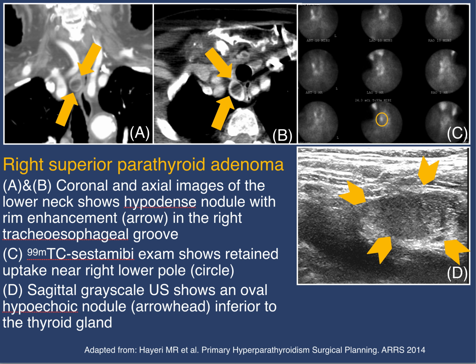This is another example where we actually used all three modalities to localize: a combination of CT, sestamibi, and an ultrasound. Given choice, I would do this every single time, but somehow that doesn't seem to fly. Usually we get a combination of the two.